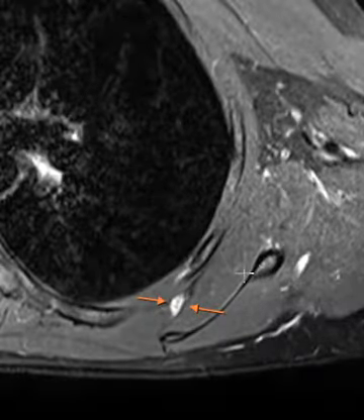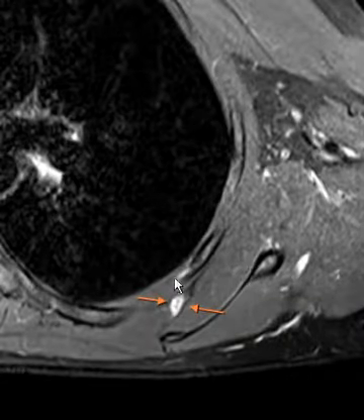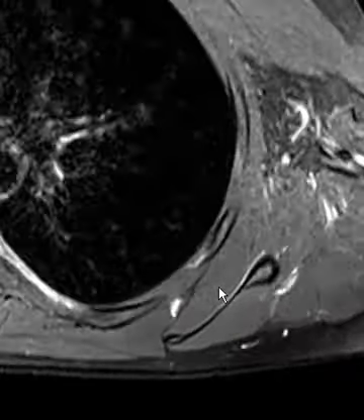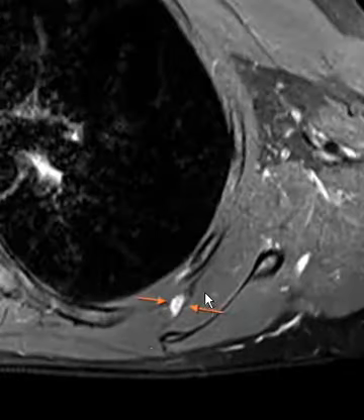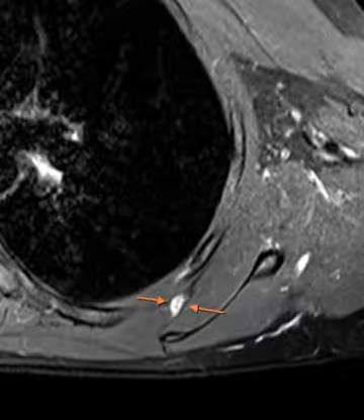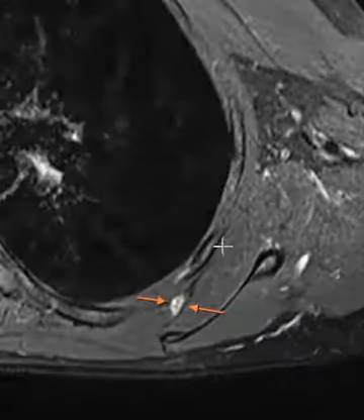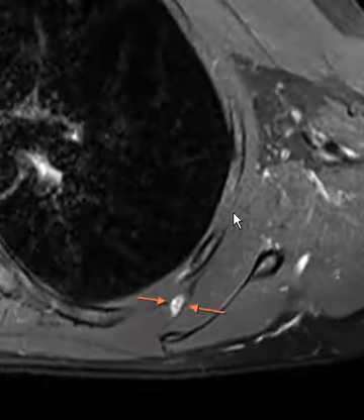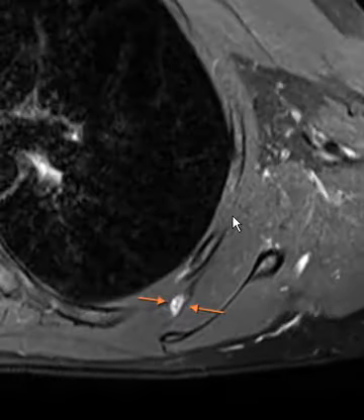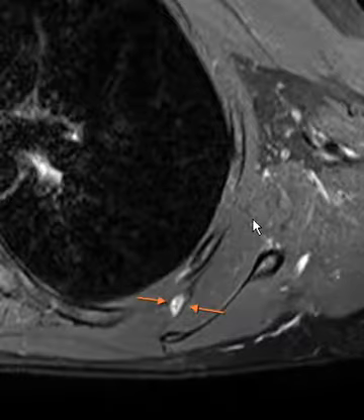But since it is the classic location, they are having pain in this region, the posterior shoulder, I definitely mention that, and maybe throw in one more thing like maybe a hemangioma could have these same signal intensity characteristics. But I just want to throw that out there in case you haven't seen elastofibromas. I think I've seen just a couple or a few over the last couple of years. They're very, very rare, and maybe gone 8 years or so without seeing one at all.